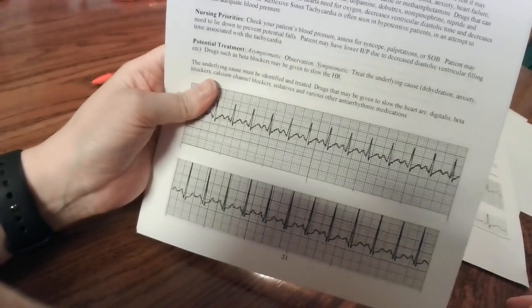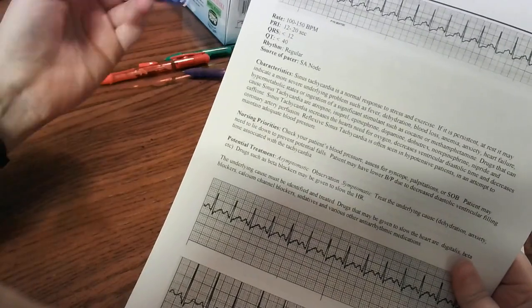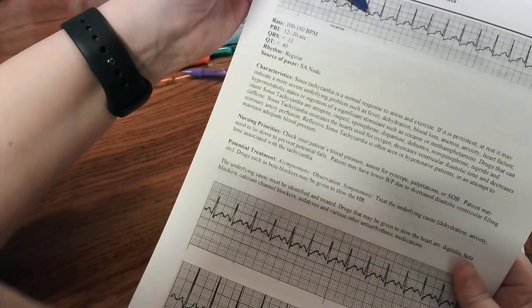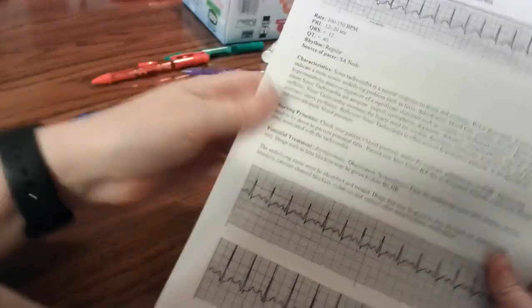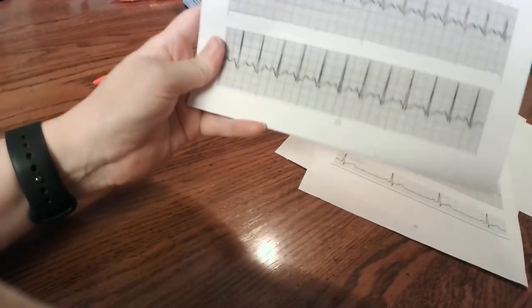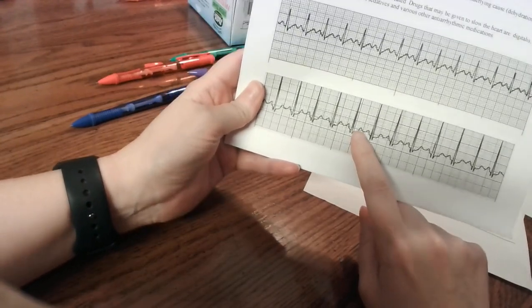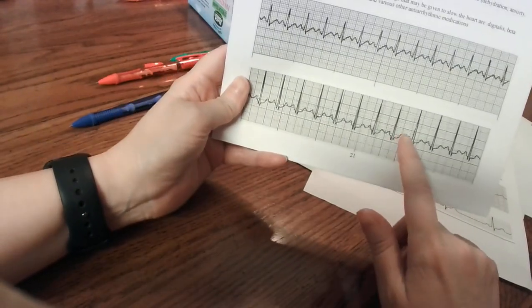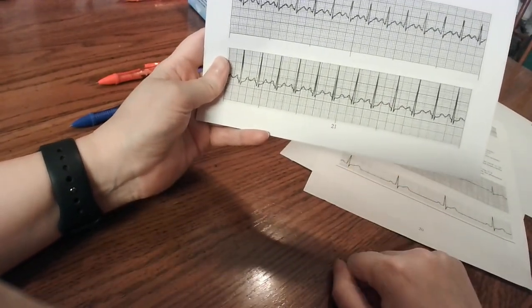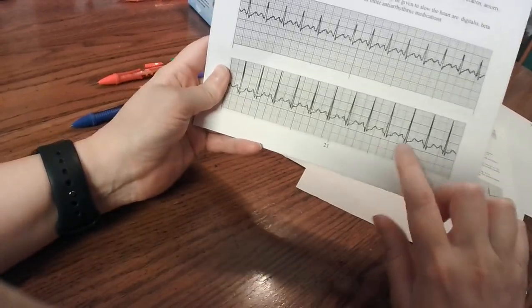And sinus tach is the opposite, greater than 100, but it has to have a PQRST. Sometimes the faster it is, the harder it is to differentiate the P waves from the T waves, but there's the T, there's the P, there's the T, and there's the P. And here's another couple of examples of that. A lot of times on tests they'll make it look like this, so it's obvious where the T and the P are. The only thing that this can be confused with is 2-to-1 A flutter, which looks almost exactly like that, and it fools a lot of people. But if they put it on a test, it's probably going to be sinus tach.